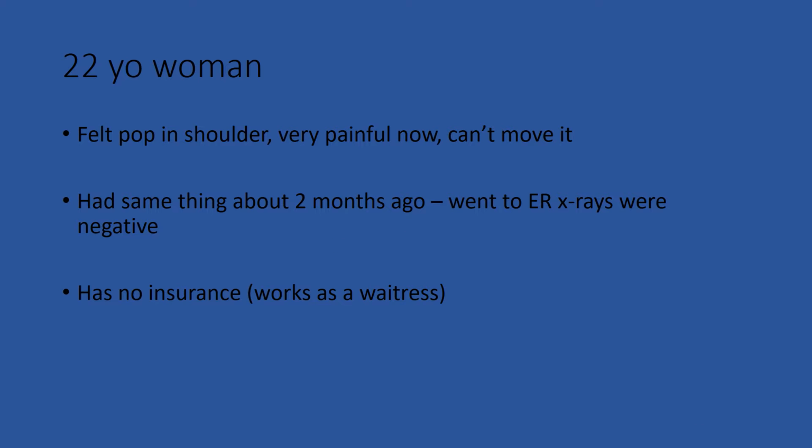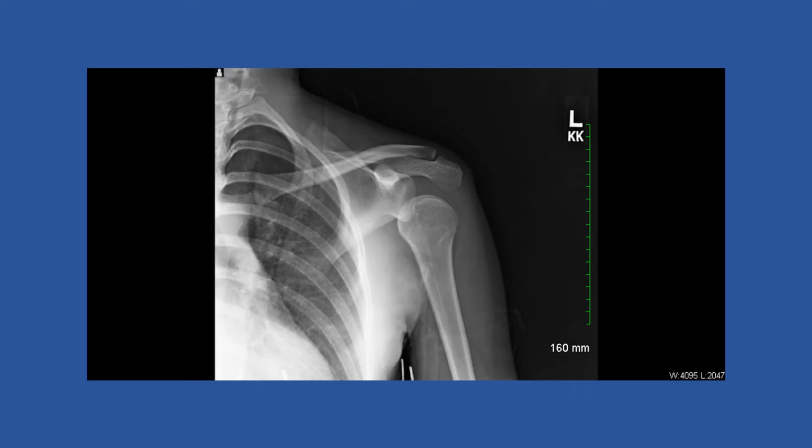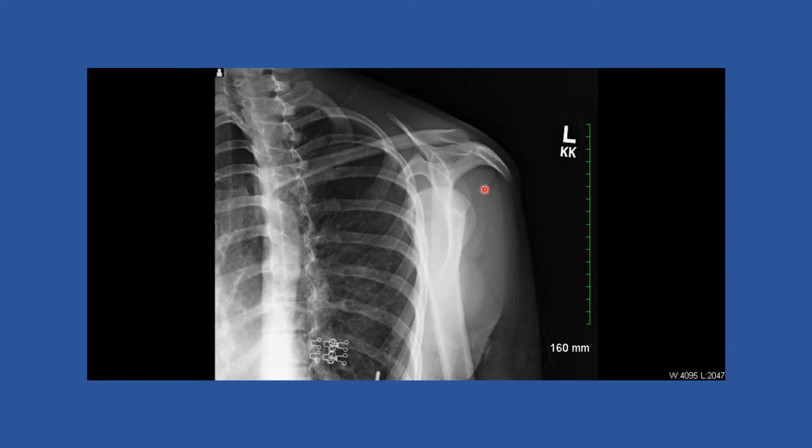On the other hand, she's having a lot of pain. So in this x-ray, we can see that there is maybe a little bit of displacement away from the glenohumeral joint here. So the glenoid fossa right there, this humerus seems to be maybe a little displaced. Usually there's other views though, and the nice thing in this case is we can see in this view that this humerus is clearly displaced. You can see pretty well that this is an anterior dislocation.